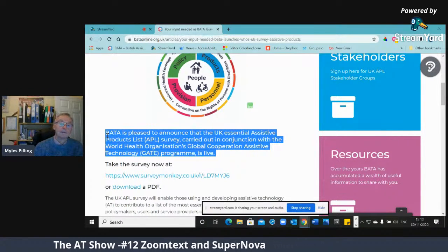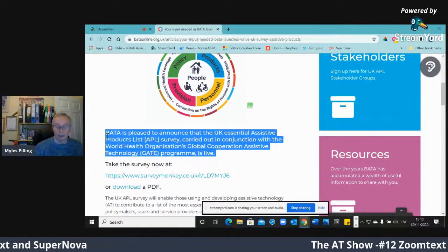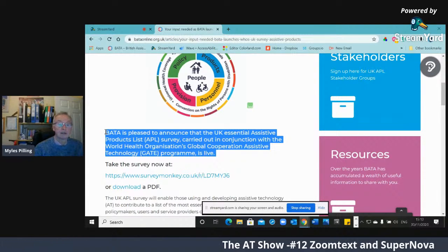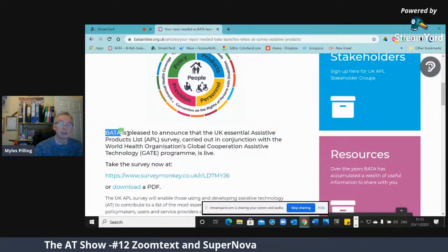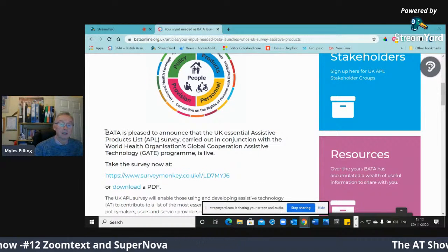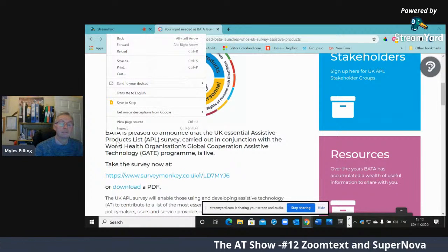Now, you probably noticed it reading code. That's what it does. It reads code as well. But you can decide to just have it reading whatever you want it to read from the cursor or anywhere.